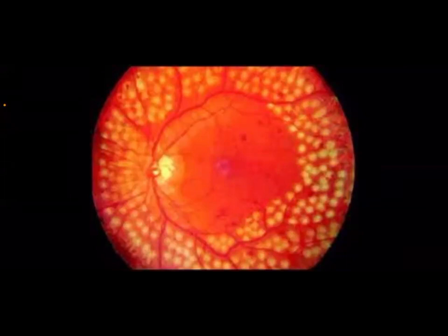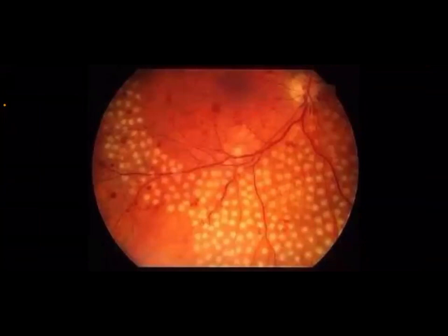Okay, so this is laser therapy. This is here again laser therapy. It is well organized. Not necessarily all of them should be black. Sometimes it will be the same color as hard exudate or the same color as the optic disc. So this is laser therapy. Already from the start you ask the patient, he told you, yes, I did laser therapy. When you come to have a look, if you find this shape, this is proliferative diabetic retinopathy and the patient did laser therapy before. You got the full mark. Finding wise, you mentioned everything.